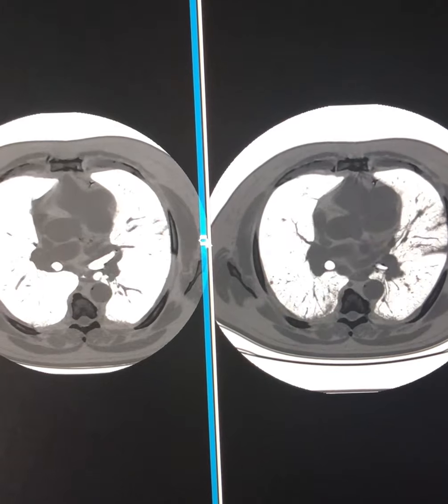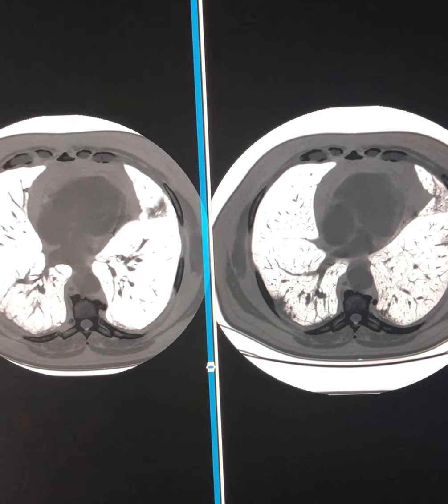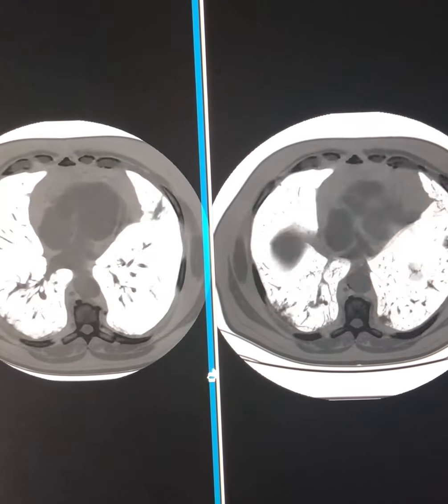So in summary, the lung moves less at the apices and greater at the bases, and your index lesions can move considerably up and down at the basal regions compared with the apical regions.